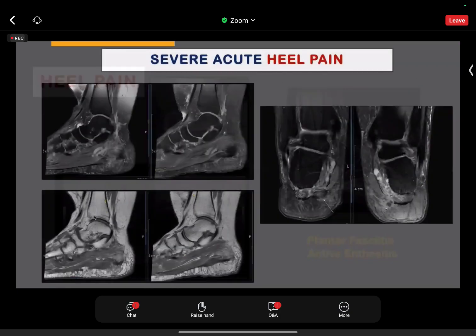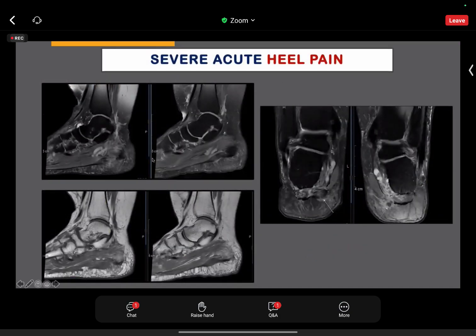But then coming to the rupture case, I don't have the ultrasound for this, but if you look at this one, you can see this is the fascia. When I do ultrasound, I start from the midfoot. I find the deep fascia and then I track it back, dipping down, going to the calcaneum. I think that's an important way of avoiding the pitfall, because if you don't do that, you can sometimes measure the muscle here. So if you start in here, you identify the fascia, then come back. You can see that it's a bit wavy, it's quite thickened, but over here it's thickened and there is a discontinuity there.